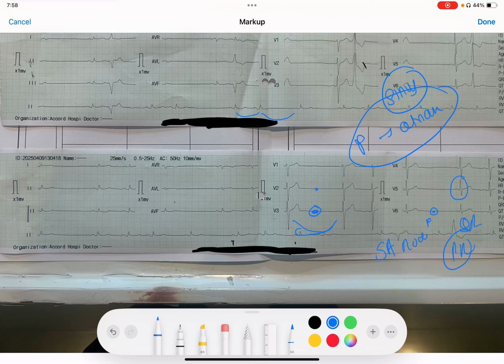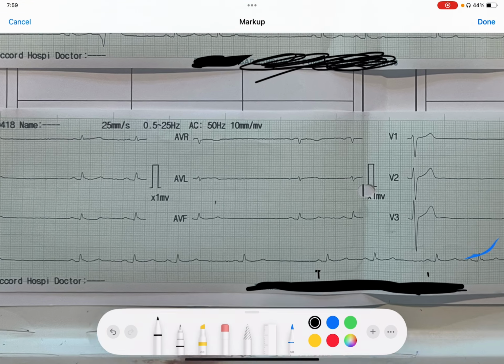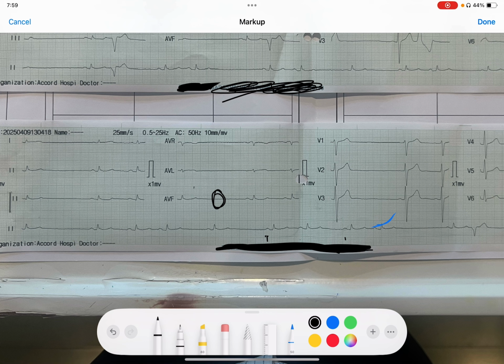That is the function to originate, to make a P wave, because only after the P wave stimulus the QRS will follow. But in here, this SA node was not functioning well. So the SA node was actually sick. So this is called sick sinus syndrome, because in sick sinus syndrome, we can get severe bradycardias, where it is not mandatory that the SA node will function. So the patient may not have a P wave, so the patient will not have QRS. So the generation of P wave is not at all sure.